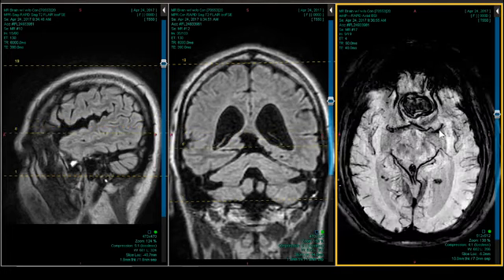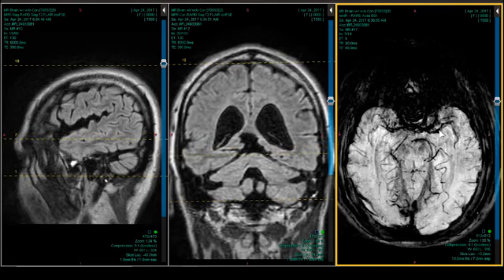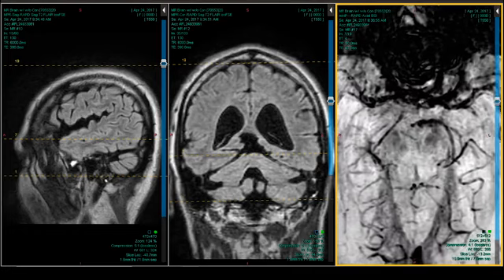And let's look at the brainstem iron. That looks rather poor, doesn't it? It looks ironopenic, if there is such a word. And how about the distribution? I'm going to make it a lot bigger because that's where we're going to hone in on.